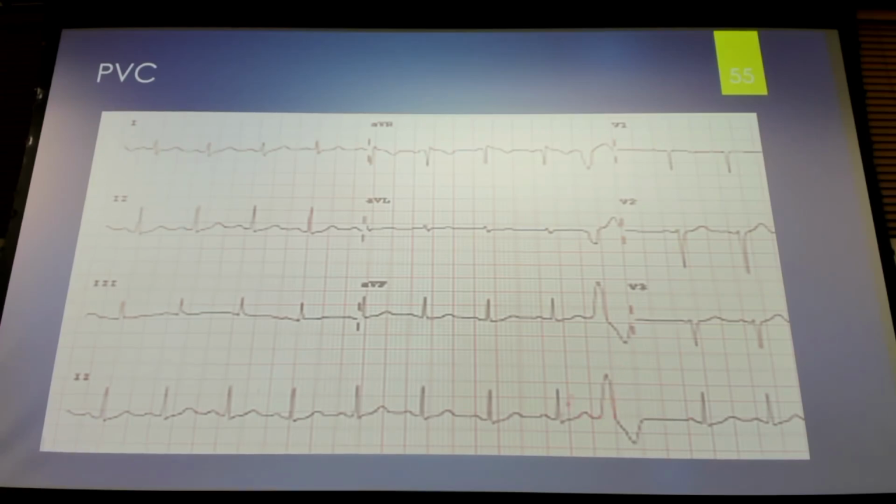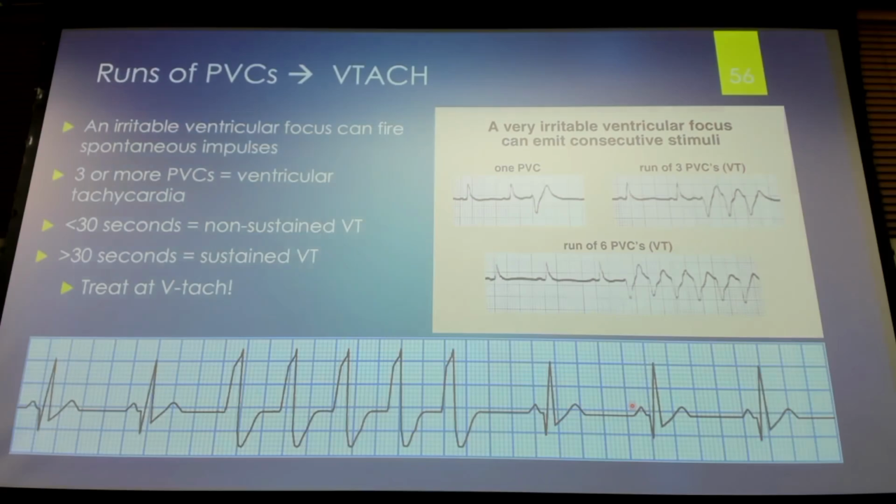Remember with these ventricular contractions, you may still have P waves in there, but we don't see a P wave specifically before, and we see this big, wide QRS complex. A big, wide QRS complex is going to be a PVC every single time. Here we have PVCs, but we have many PVCs. What does that remind you of? VTAC.